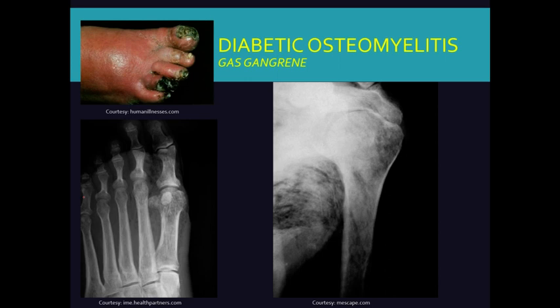Additionally, what you can see with osteomyelitis of any cause and cellulitis, but more commonly in diabetics, is gangrene. So if we look at the subcutaneous tissues and then in the tissues on the axilla here, we can see these lucent streaks throughout them. This is all subcutaneous emphysema, consistent with a gas gangrene.